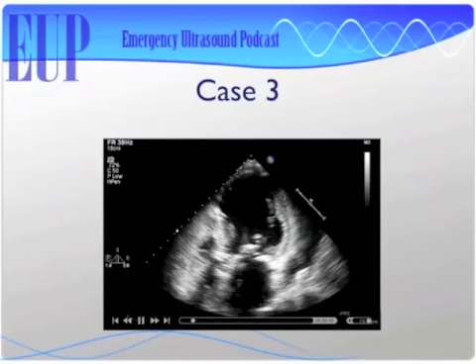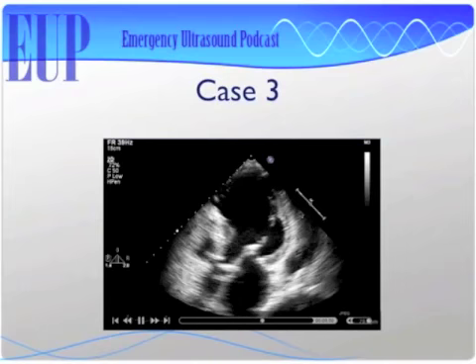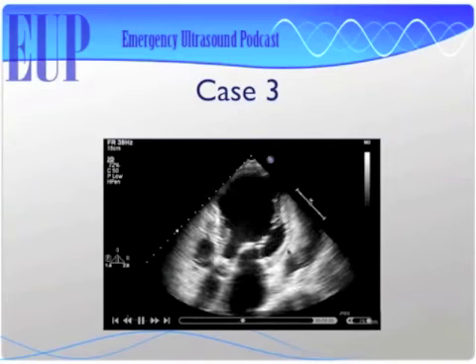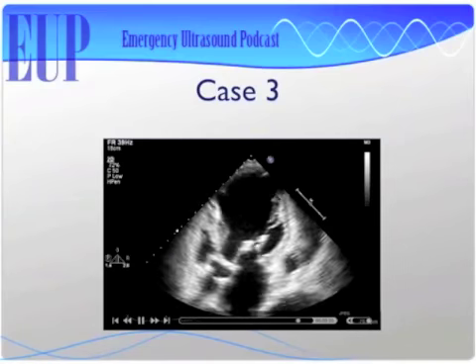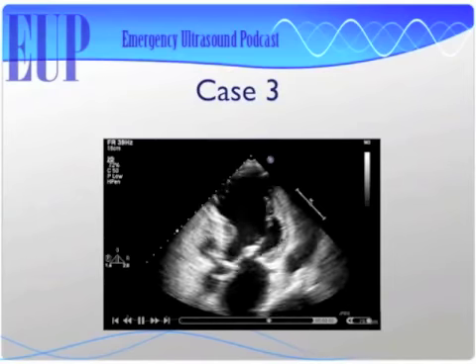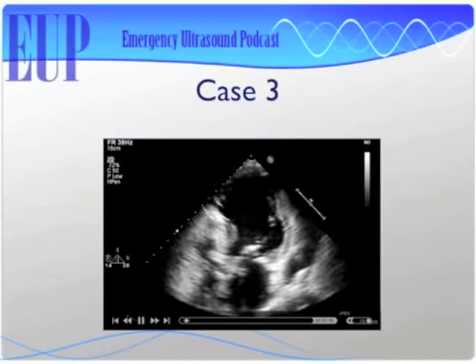And then over here, when we're talking about the inferior lateral wall, which coronary distribution is that? Our circumflex. Circumflex, awesome, perfect. So this is the circumflex area over here, and you can see that maybe there's a little bit of function right here towards the base, but up in here it's pretty crappy, if anything.